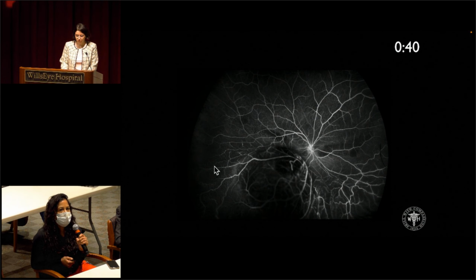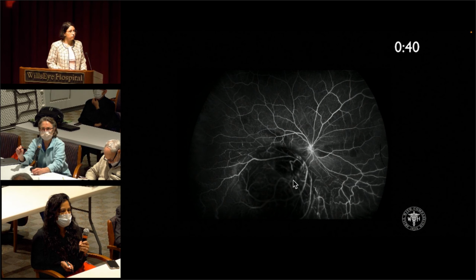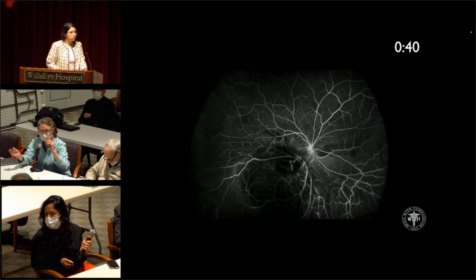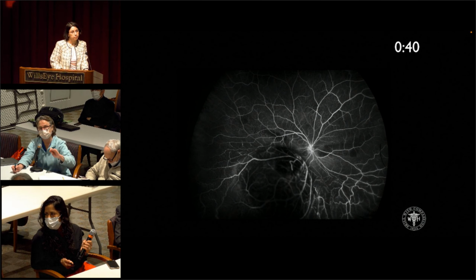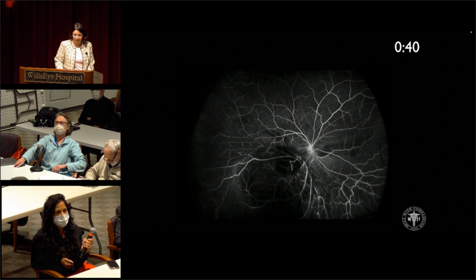Just to make one point too, right here, this vessel is a little bothersome. Because if we're saying this is a mass deep to the retina, maybe in the choroid, there should be no retinal vessels feeding into it or draining it, except rarely you can see a draining retinal vein in an eye with a melanoma. So if there's breakthrough of Bruch's membrane and retinal invasion of a melanoma, you can get a draining vein. So let's follow this. I think this is a vein. Let's follow that. That's a great point.